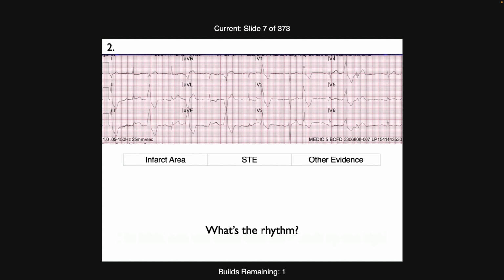Possibly there's going to be a posterior, we see a tiny bit of ST depression here, but it would be very helpful to run off a couple more 12 leads so we at least get more sinus beats to look at. There's no question, as Koa said, we have the inferior STEMI with ST depression in the high lateral. So just a good rule of thumb, whenever you're analyzing any 12 lead, if there are ventricular ectopic beats, ignore them. They're going to confuse you. You can scribble them out, put a piece of paper over them, whatever, just ignore them.